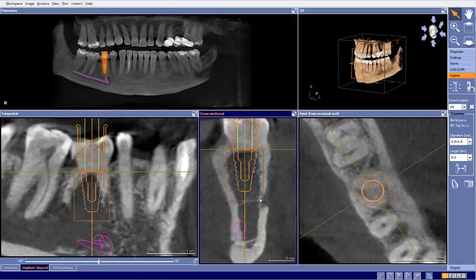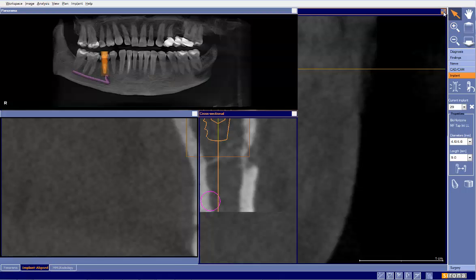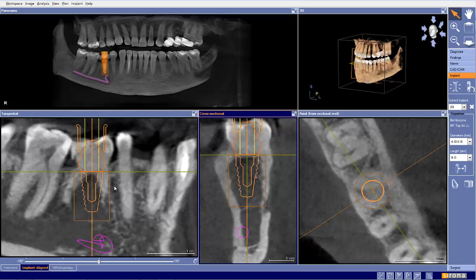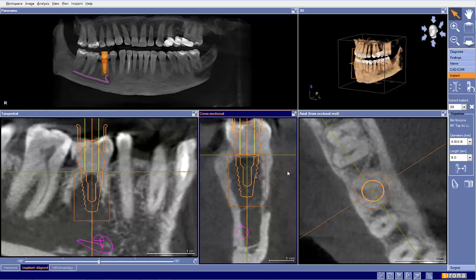And here we can see the exit of the mental foramen. So, again, I could probably get away with a 10.5 millimeter implant, but that is really getting close in what looks to be an anterior loop here. So in this particular case, I would probably go with a 9 millimeter implant. Doing socket preservation is going to be of no use here because these roots on baby teeth are so diverged that this is essentially a fresh site that we're placing the implant in.